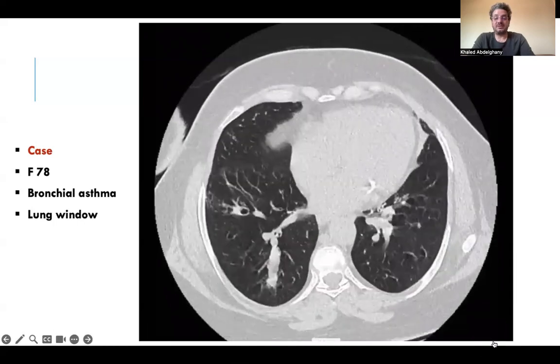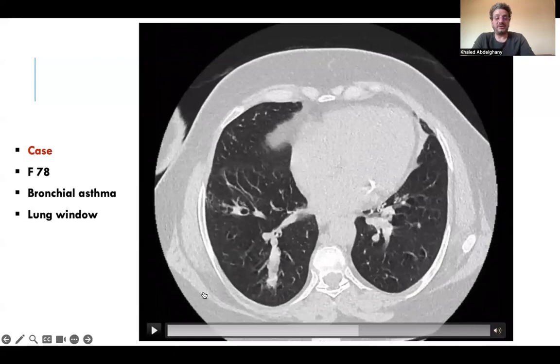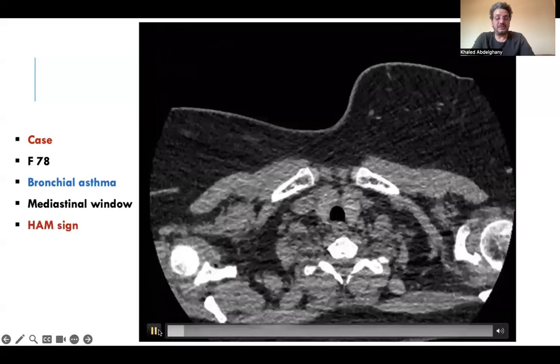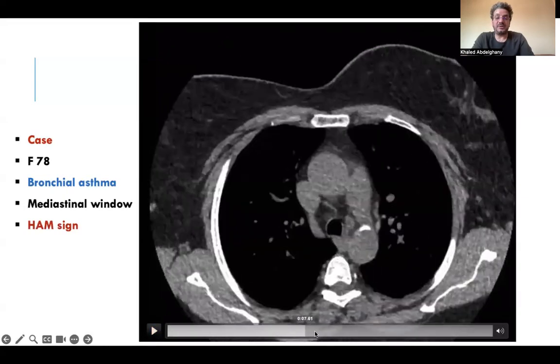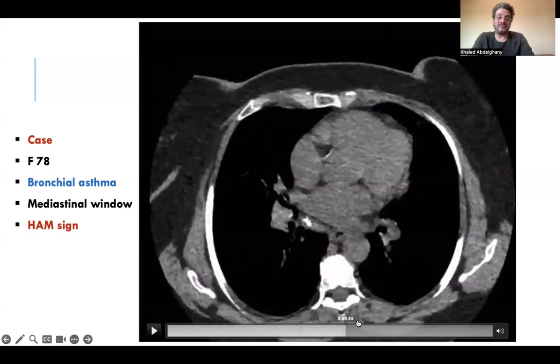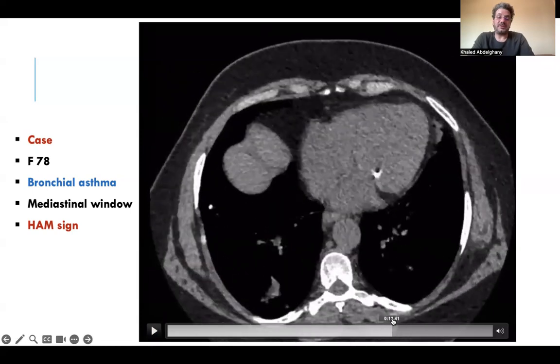In this patient, also to complete the discussion, the patient has old TB sequelae, with calcific hilar lymph nodes and the presence of a calcific pulmonary nodule as well. So this patient has allergic bronchopulmonary aspergillosis on top of old TB sequela.